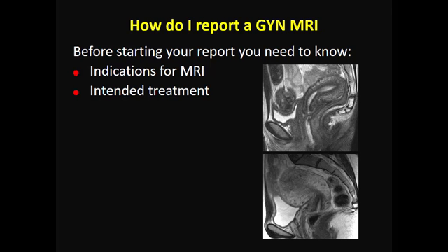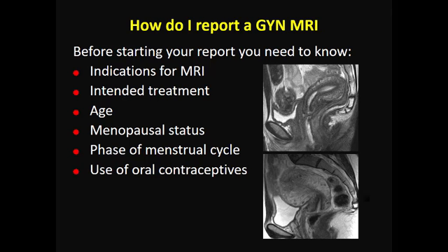And that's really important. Like this case here, this was a patient who had an MRI of the spine for back pain, and it was reported by a neuroradiologist a few years back now, and they thought the uterus was really abnormal. They got worried about the possibility of a sarcoma. But actually, this is a classic appearance of somebody on long-term oral contraceptives, when you have a lot of endometrial and inner myometrium junctional zone atrophy and a globular myometrium. So once you know the pitfall, then you can easily sort it out. And that was actually the case when the patient was asked.